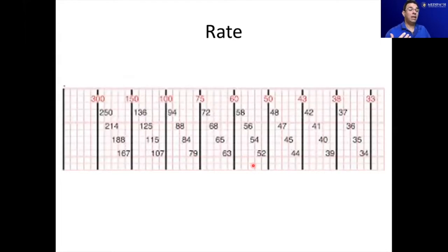Although when you look at an EKG, on the top of it, oftentimes it will give you the rates and the rhythms. It's important to know what they are yourself, because if they're irregular, they cannot be accurate. Sometimes if the T wave is too enlarged, it can be inaccurate. So those are reasons you might not want to look at those, okay?